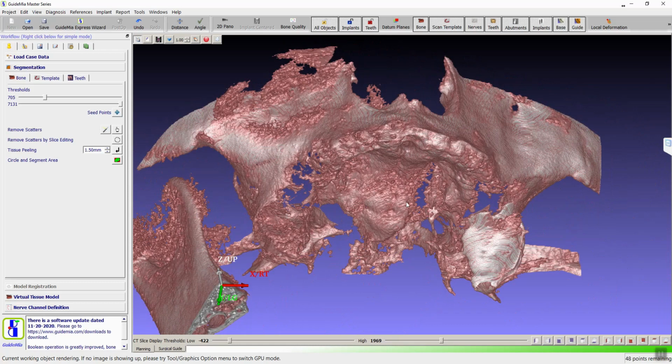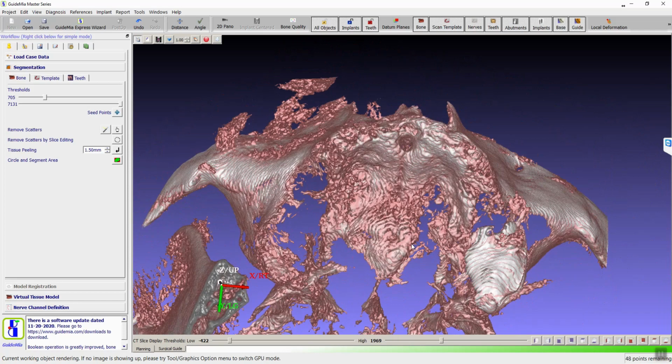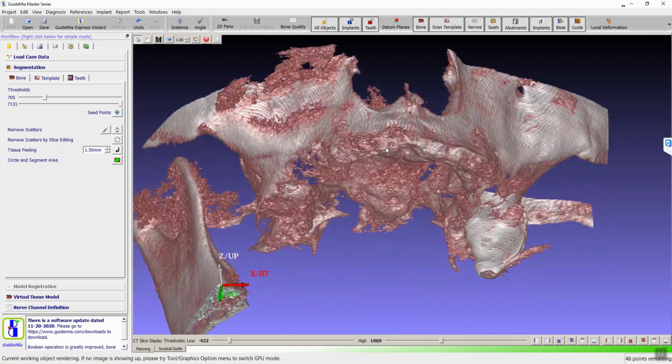So in that situation we cannot really just use this piece to do the bone reduction, because there's nowhere to seat the guide. I was telling Brian I have been working on this for a couple of times, but we didn't finish until we saw this case. So I told myself, let's just get this done.